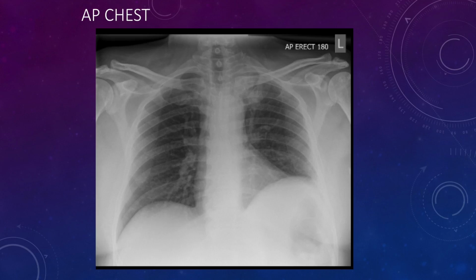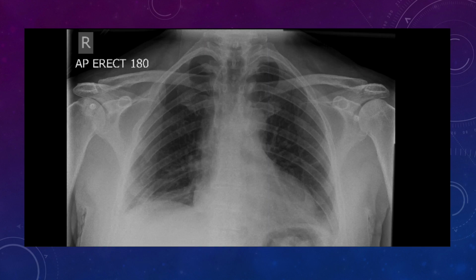And you might get a shoulder film that's giving you this, and they might have come in with maybe shoulder pain, because classically a Pancoast type tumour will give you radiculopathy symptoms, and the natural reaction from your GP examining you, they'll be thinking you might have degenerative change in the shoulder, you might have some spondylosis in the neck, and then that becomes their primary diagnosis. In this case, unusual as it is, left lung apex, and this is a Pancoast tumour, or apical tumour. It's just appreciating the difference in density, it's all it is. And if you've got that chest x-ray to go back, you have a look, okay?